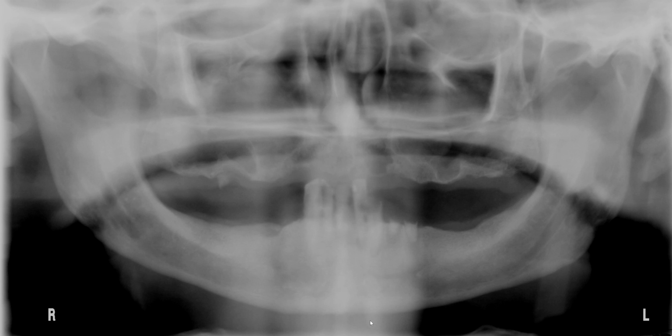Hello everyone. In this video, I would like to demonstrate anterior loop of mental foramen on both sides. So this morning, I was asked by a student to determine what this opacity was. One of the differentials he had was condensing osteitis, and he had difficulty figuring out what was going on on this side of the patient's jaw.